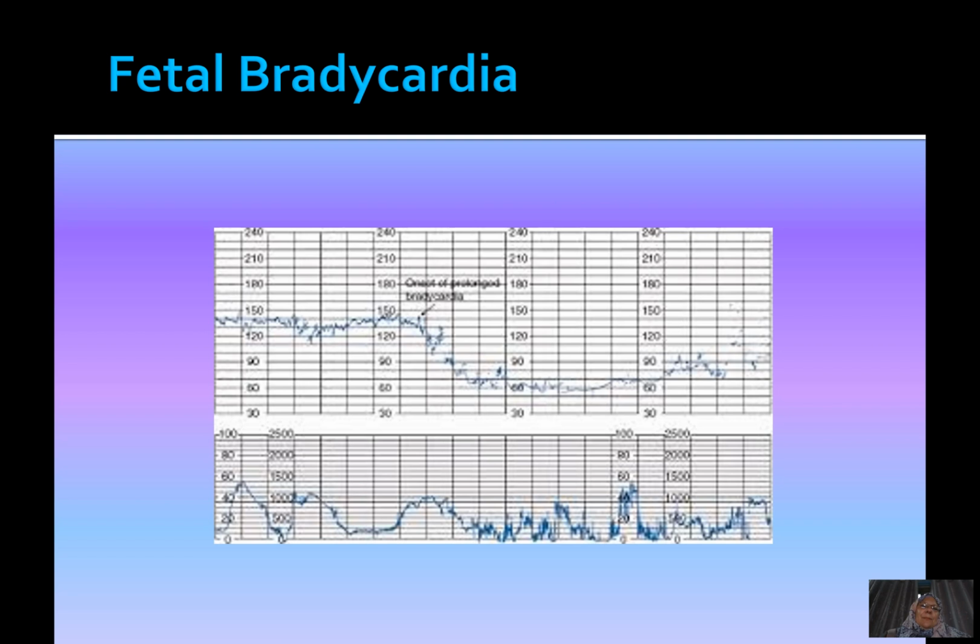And in this picture, if we interpret it, we can see that there are contractions, but we cannot say if they are regular or not, because later on this appears to be disrupted by some movement artifacts. If we look at the CTG, the baseline rate was between 140 and 150. The variability is good. There are no accelerations on this CTG, but there is a deceleration. We see a sharp decrease in the baseline rate, going down to 60 and staying there for more than 4 minutes. So this means that it is a fetal bradycardia. This is a severe abnormality in the CTG and needs immediate action.